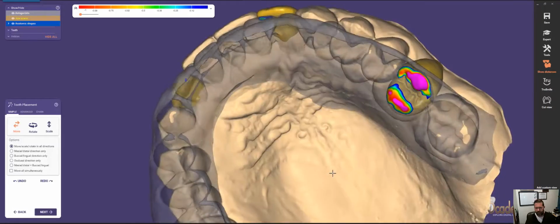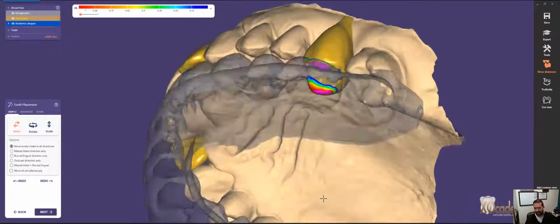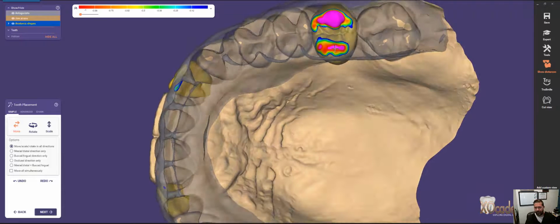Like I said, I'm not trying to spend too much time on this. This is just something quick and dirty.